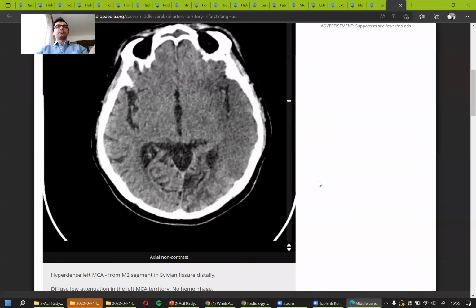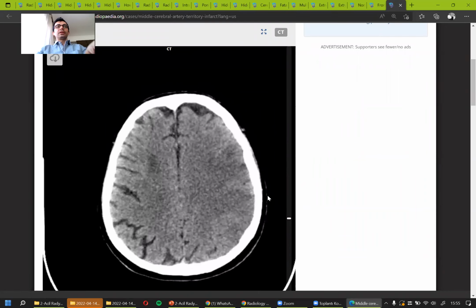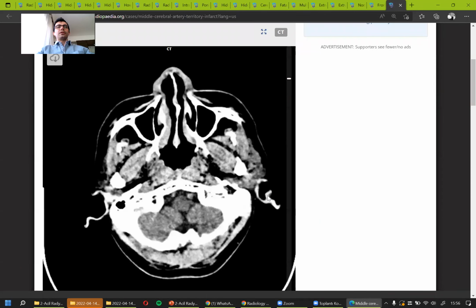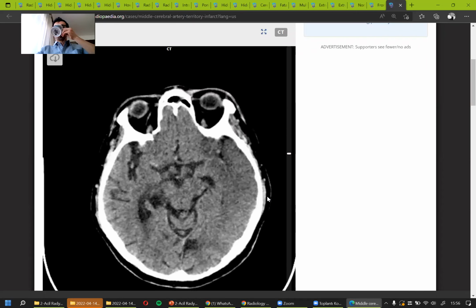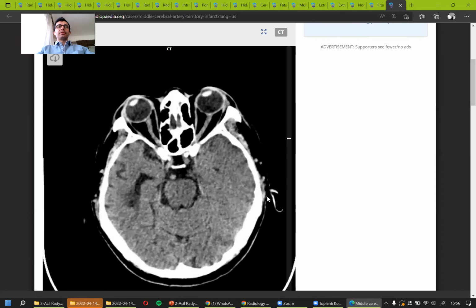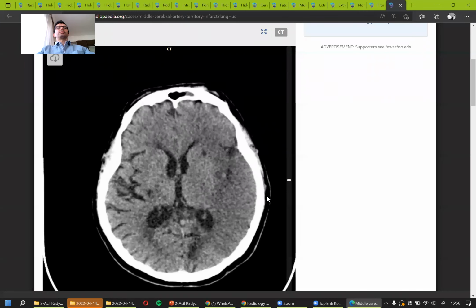Acute. All right. That's not right, by the way. Anyway, the patient has hemiplegia. So I'm looking at the CT scan, looking for bleeding. That can happen with bleeding as well. Can you see any area with bleeding? I can't. It's pretty much symmetrical everywhere. There is nothing dense. So, does anybody recognize some asymmetrical appearance anywhere?